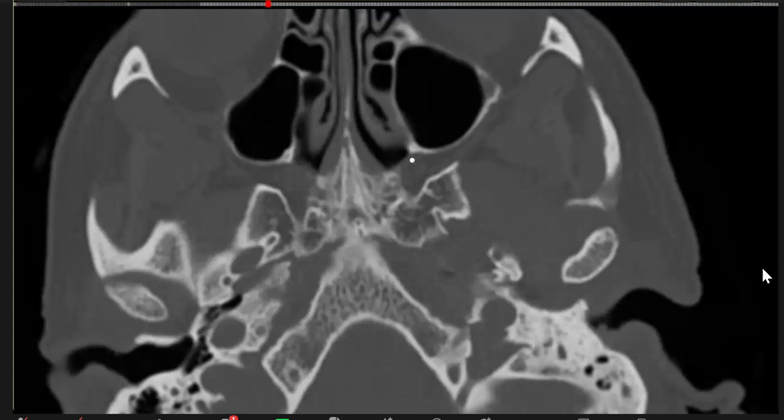This is the palatine fissure. Sorry, sphenopalatine foramen. This communicates with the superior meatus of the nasal cavity. I repeat, sphenopalatine foramen. But it is covered by mucous membrane, etc., in a living person. So pathology from the nasal cavity can go here.